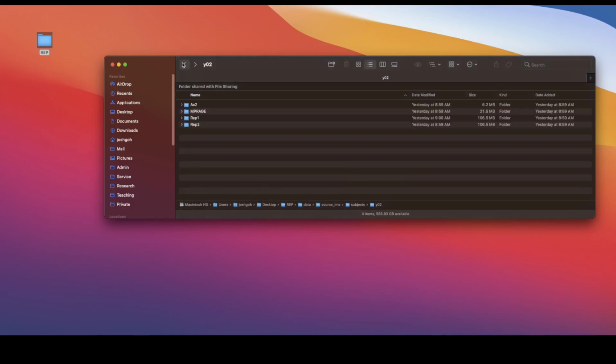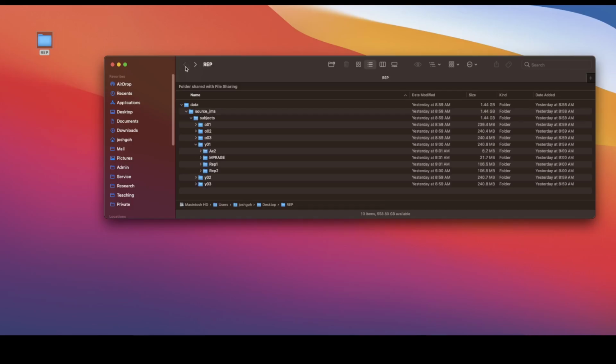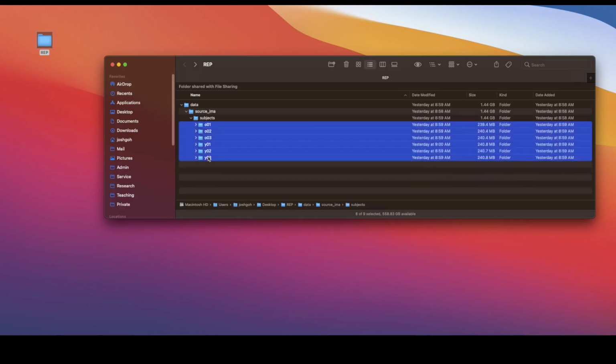Okay, so this video clip is to orientate you to the Dicom image data set that you download. You will have many more subjects than I do. I think you have 17 or 19 young and older adults together, close to 37 or 40 subjects altogether. You need to download all of them.